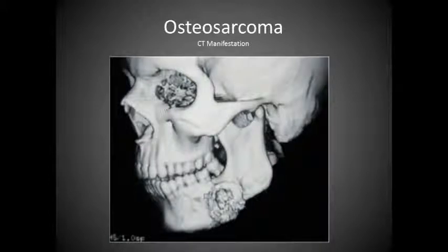Here is one on the jaw. And as you can see, it kind of has the center, and it's spreading from the center. And this just kind of rough appearance. Typically when you're doing volume rendering, you're going to see a nice smooth appearance for the mandible, just like this. And notice when you get to this area, it all changes.